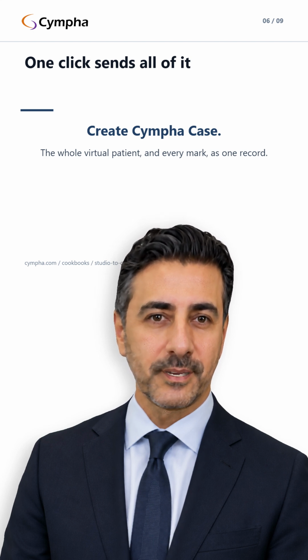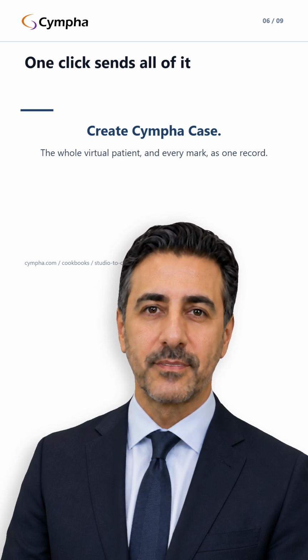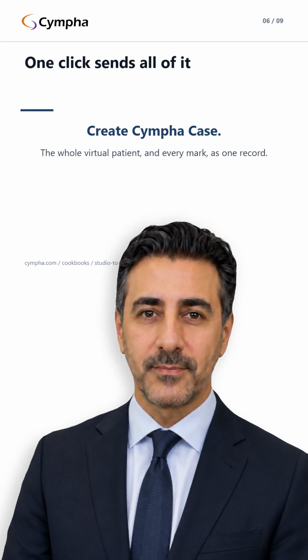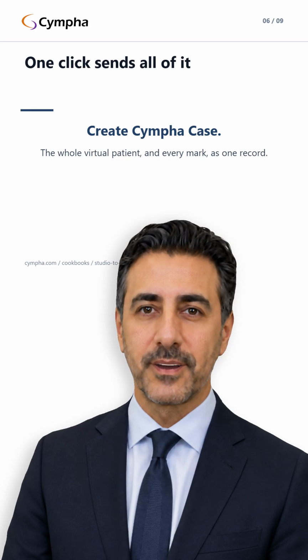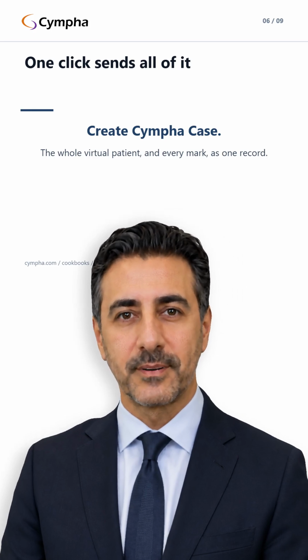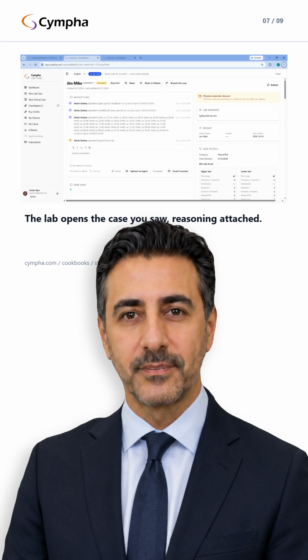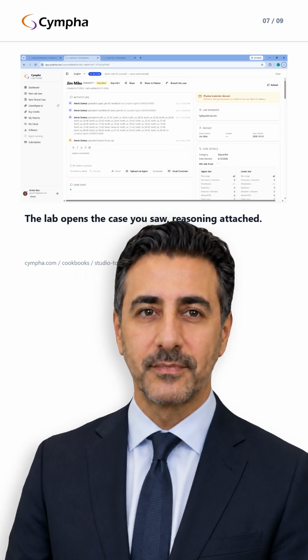When you are ready, you reach for one item in the menu, Create Cympha Case. That is it. The entire virtual patient and everything you marked on it travels as a single self-contained record into a new case. You still submit through the normal case form. Nothing about your routing or your prescription changes. The case just arrives far richer.